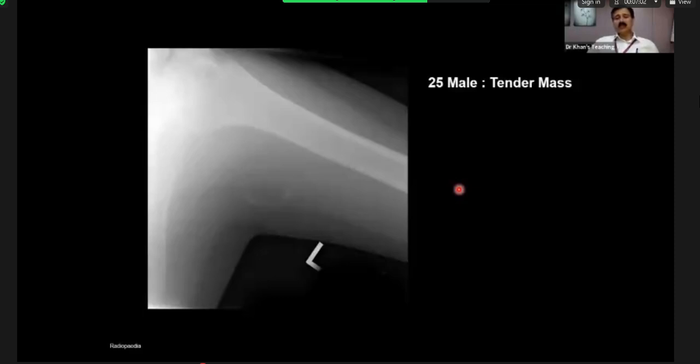word tells you, because of trauma there might be hemorrhage, and then there is ossification. Key thing to remember that the ossification initially is at the periphery. That's a very good sign. And gradually, if you see the same case after 6 months or 1 year, it might have ossified all of this. So this is a key thing, because these patients can present with a lot of symptoms.